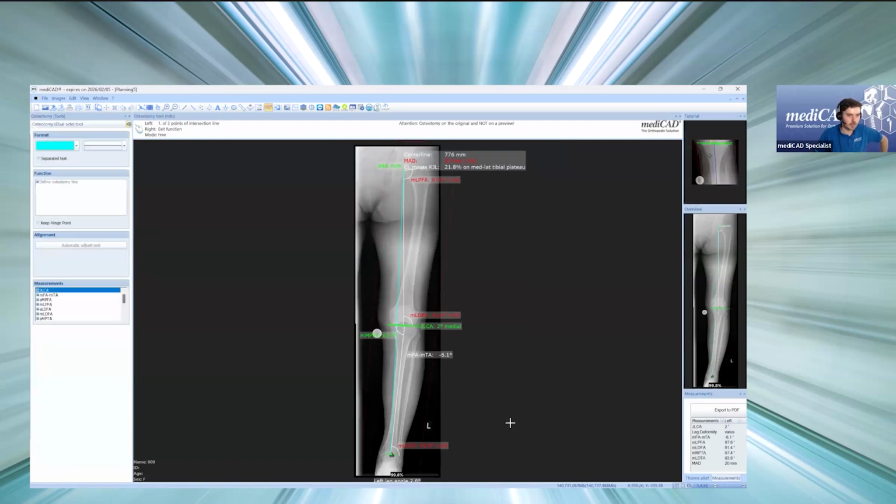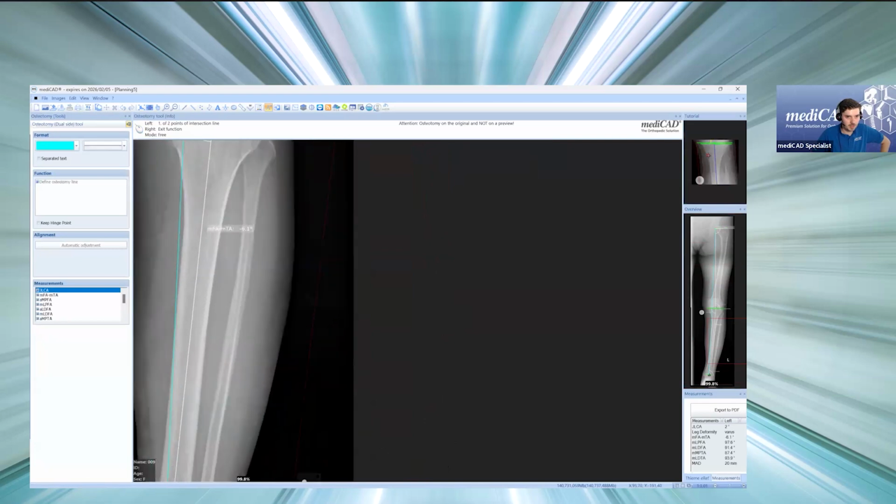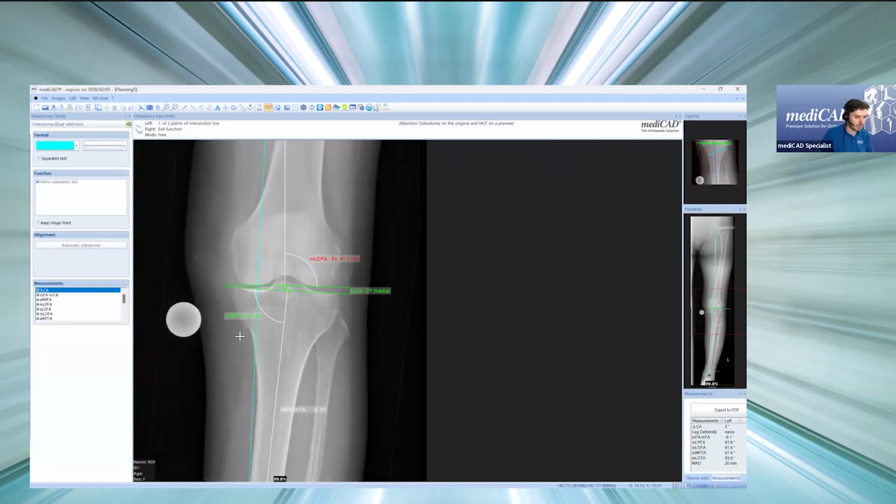So now we can go to select osteotomy. Another new feature here is because, especially in trainings for new users of the osteotomy tool, we get that a lot, that it's not always clear, hey, I want to do an open wedge HTO or closed wedge DFO, but I'm not actually sure what I need to do here. That is generally because what the software does is it needs basically information about where's the cut, where's the rotation center, and then it will basically automatically correct to 0 degree varus valgus. And depending on what is needed for that, it will do either an open wedge or closed wedge.